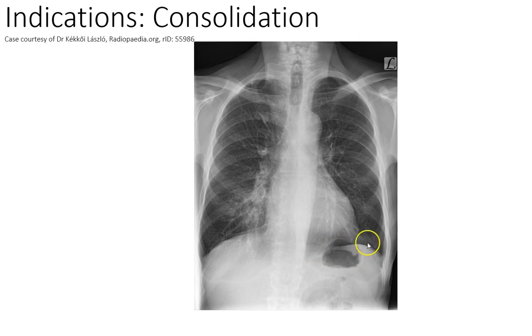The hemidiaphragm looks good. It's a little bit less distinct here, but not so much as on the other side. And that heart border looks fairly crisp. The heart, there's a nice bulge on the right, majority of it is on the left, so it's in a normal position. And the size of it, it looks to be about a half to me, so that looks good.